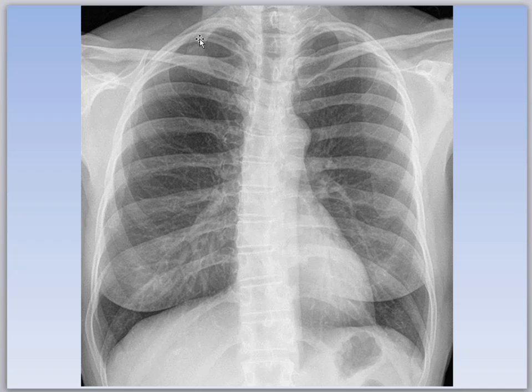And let's see, what else can I show you. First rib again coming around. Anterior part is here. Is this a rib right here? No, that's the clavicle. Okay, second rib would be coming around like this. Third rib is a little harder. It's superimposed on the clavicle, but there's the third rib.